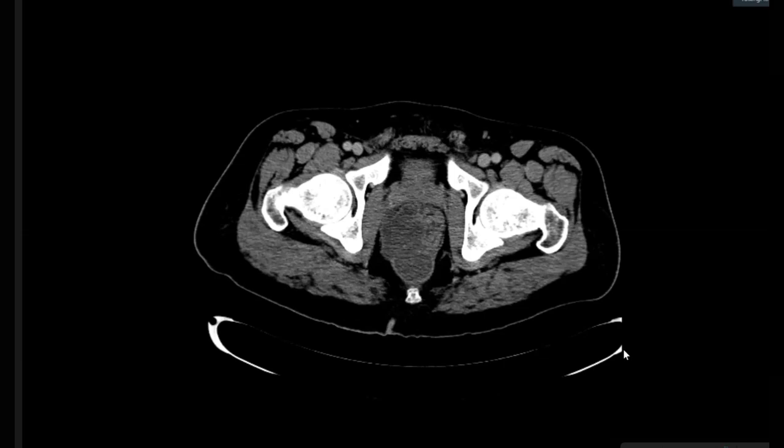Okay, sir. There is a hypodense, lobulated lesion with enhancing walls in the right lateral wall of the rectum, involving the lateral and inferior wall of the rectum. Also, the lumen is displaced towards the left and slightly superiorly. There is no perirectal stranding. The adjacent muscles appear to be intact with no involvement by this lesion, and there is no lymphadenopathy. So my impression is that it could be a collection in the region of the rectal wall, or it can be a developing abscess.